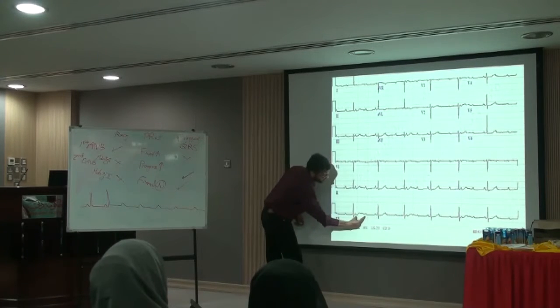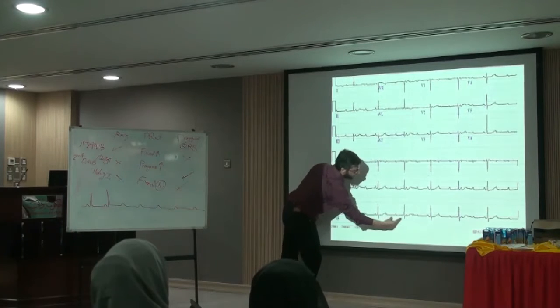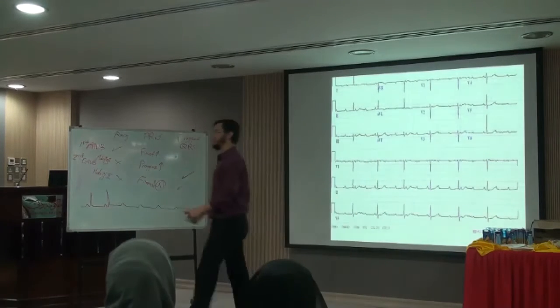Let's go back. Okay. This is a P wave. This is a P wave. So this is a P wave. This is a P wave. This is a P wave. So you will see that the PP intervals are equal. Excellent.